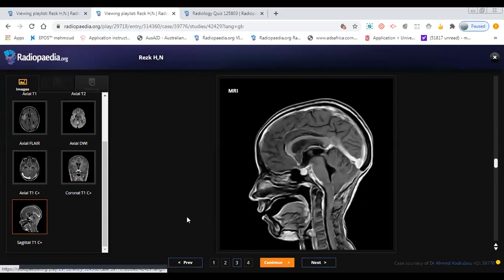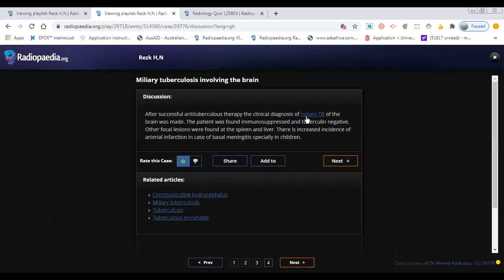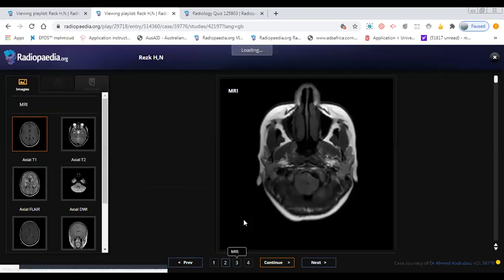I think it's a bit difficult, but you can see this meninges here enhancing. Yeah. So this is TB, right. So this patient is on anti-tuberculosis treatment, exactly, TB. And when we saw this enhancing meninges the second time, maybe we can consider it, yes, exactly, here.